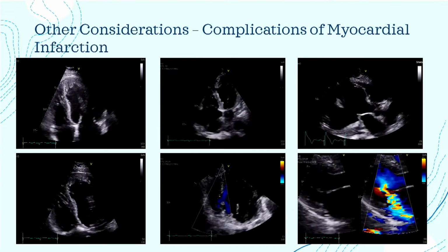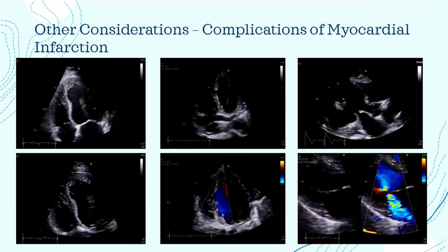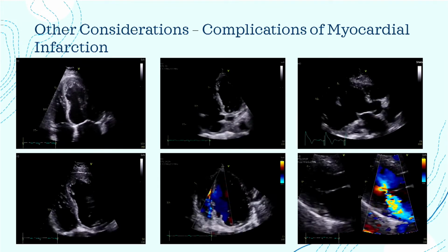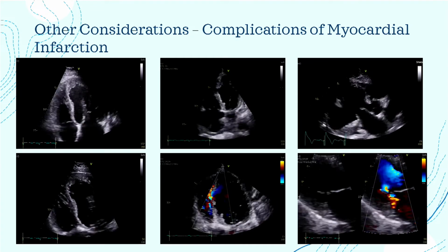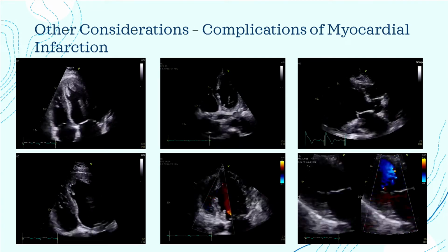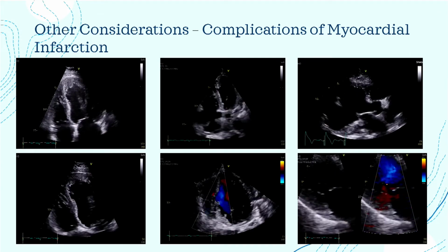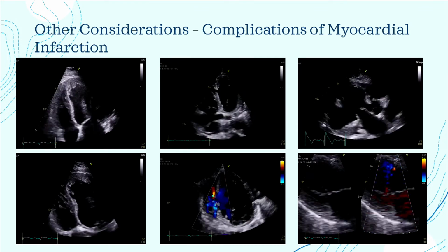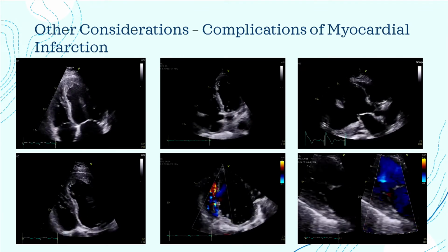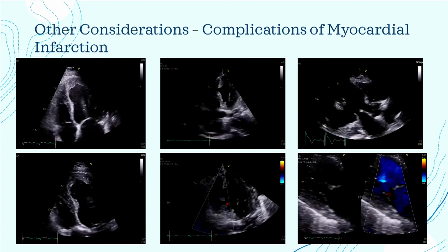Also look out for post-infarct VSDs. You'll have to search quite hard, depending on which wall, so which view you're going to see it in. I think it's pretty obvious in the middle slide. About midway down the septum, you can see a little area where it's a little bit deficient in tissue, and the slide underneath with a colour shows a VSD. The patient doesn't necessarily need to be really poorly. Sometimes they're quite stable, so just because they're stable doesn't mean there isn't one.